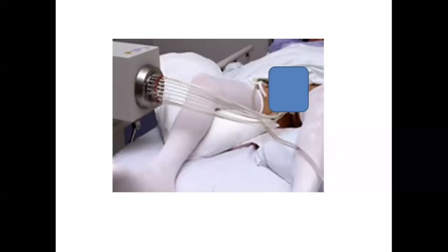Once that procedure is finished, so the actual process of delivering the radiation with that wire going in and out takes about 20 minutes, half an hour maybe. So that's actually the shortest part of the day, but we're talking now about mid-afternoon, late afternoon, by the time the patient gets around to having this part of the treatment, after having come in at sort of 7:30 in the morning. So it's a long old day for both patient and staff.